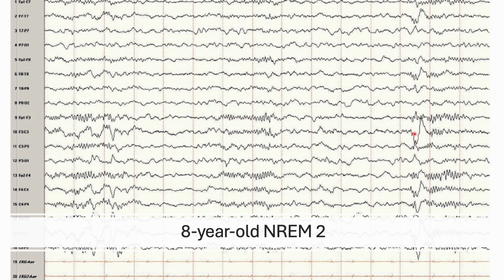But with this EEG, remember, I'm throwing up some funny EEG things. This is not a typical sleep montage. It's for looking at seizures and stuff. So it's looking from F3 to C3. If this was F3 to M2, this K-complex would be backwards. It would be up and then down. So that's why it looks like that.